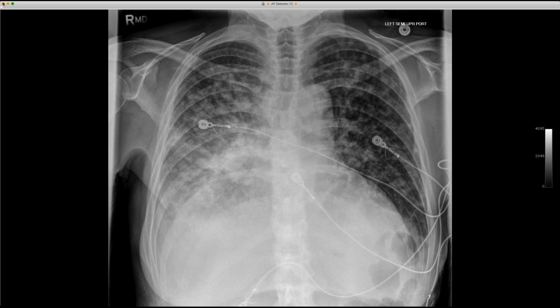So Jeff, she was a kidney transplant. Yes. Okay. And this absence of pleural effusion, I think that may apply to our Cryptococcus gattii cases too. There was a discussion of one of our cases that I showed a couple of years ago to this group, but it was rediscussed this last week. And I was going through the CT and remembered what you said about blasto not having much in the way of pleural effusion. I think you also said there's not much in the way of lymphadenopathy. That is correct. In contrast to histoplasmosis, where we see a lot of lymphadenopathy, even sometimes out of proportion to the lung, the nidus in the lung.